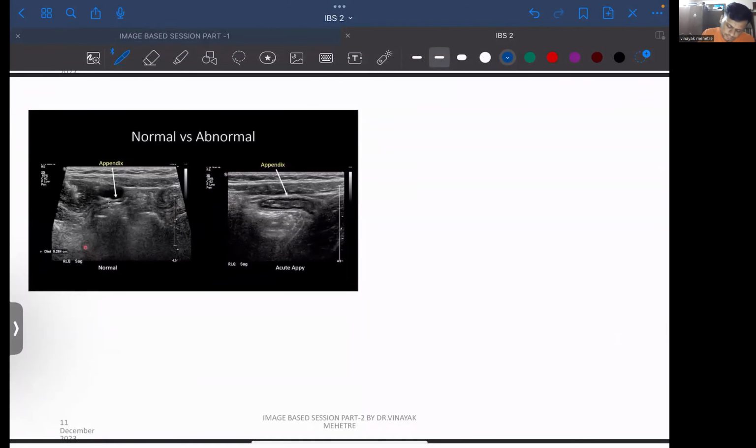सी, नॉर्मली अपेंडिक्स की थिकनेस नहीं बढ़ती. व्हाट वी आर गुड आई एम टेलिंग, अपेंडिक्स की थिकनेस नहीं बड़ी होती, बट इफ देर इज इंक्रीज इन एपी डायमीटर, आंसर इज एक्यूट अपेंडिसाइटिस.